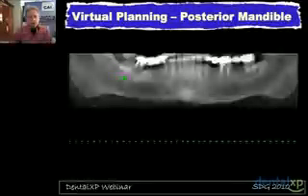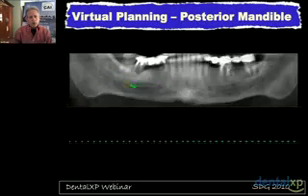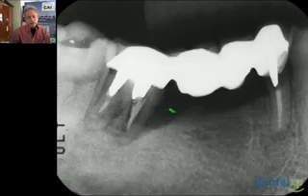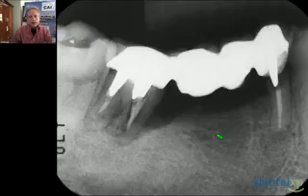and we can see where the inferior alveolar nerve traverses through the mandible, and we can see very, very clearly that this patient is having a problem, but it might be better if I blew up that area so that you can see it a little bit better. So here you can see the defect that exists here, maybe some fracture in this tooth, decay certainly under this 4-unit bridge in the posterior mandible.